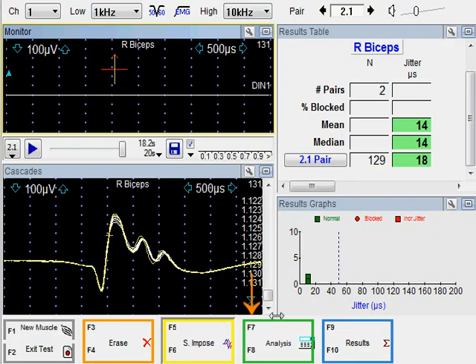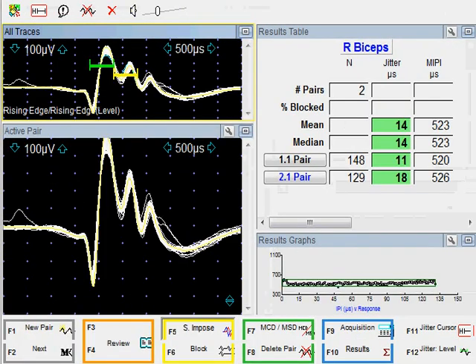and then go into the analysis mode. This is done by pushing the function key F7 or F8. So this is the manual method of invoking analysis. Here is a triplet. I can do multiple jitter measurements. Again, I will describe this later.